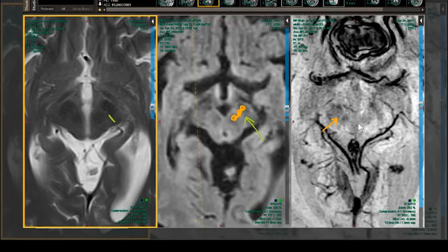Now we're going to see in the vascular section what some of these hemorrhages look like, but what you get in amyloid is a big hemorrhage with little mass effect, and it's lobar. It's not in the basal ganglia, like a hypertensive hemorrhage. This is lobar, big, but kind of shadowy, not a really dense, bright area, with little mass effect. So you never operate on those people. I have had that horrible experience, because when you try to operate on them, you can't get out of the OR. They're just bleeding and bleeding and bleeding, because it's a microvasculopathy.